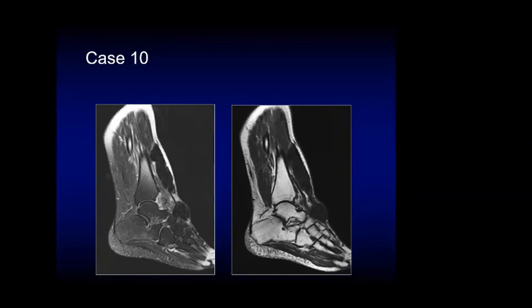It is hypointense on T1 and T2, homogeneous. The differential is between osteochondromatosis or pigmented villonodular synovitis. Here it could also be hemophilia, or it could be fibrous content. So there are multiple differentials. Okay, so I would need enhancement, and I would need an X-ray if available.